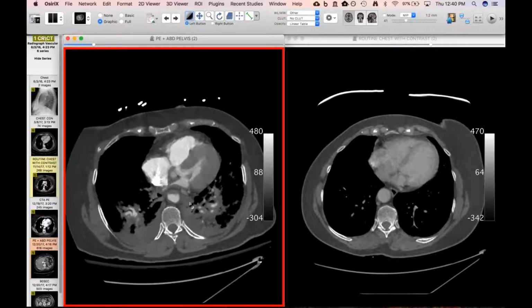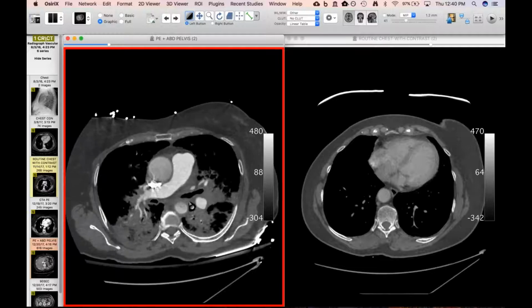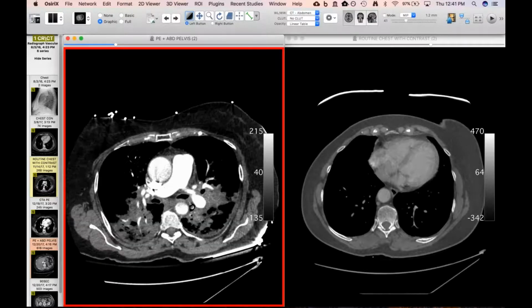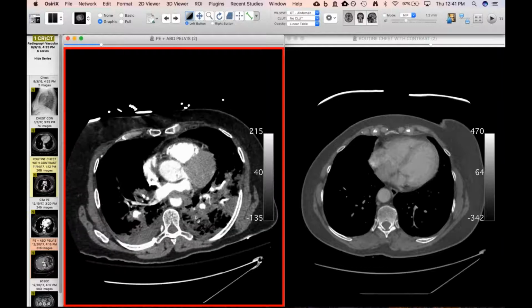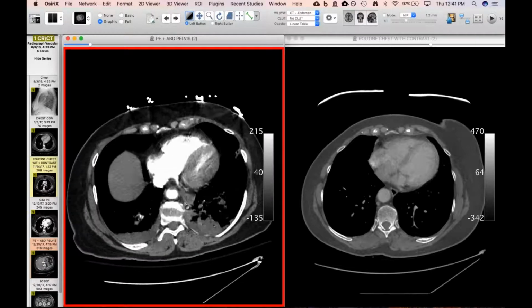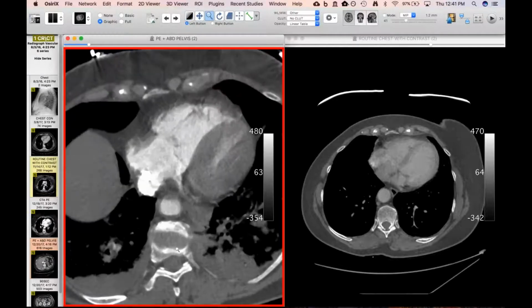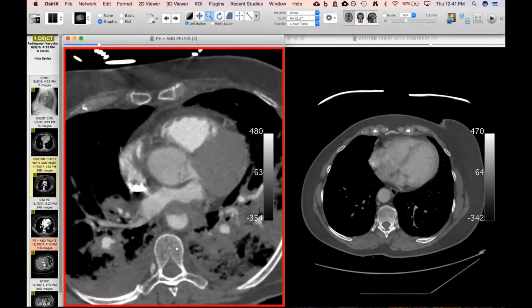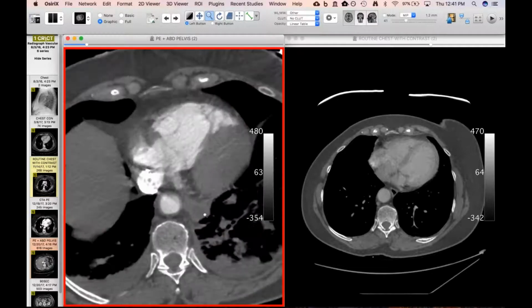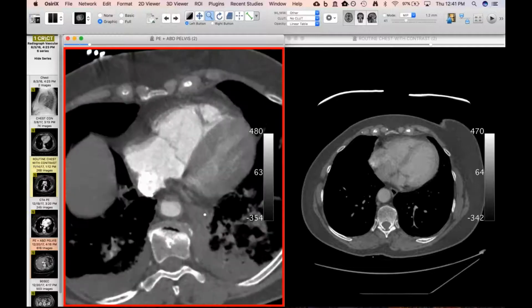But what's interesting now, as you see in her aorta, I showed that case of aortic smoke last week, and this is a case, again, along the anterior portion. I don't even think this is from flow as much as it is maybe just from slow output and almost gravity with a fluid contrast level in her aorta. Some of this may be due to her reduced cardiac output. But I thought this was kind of interesting.